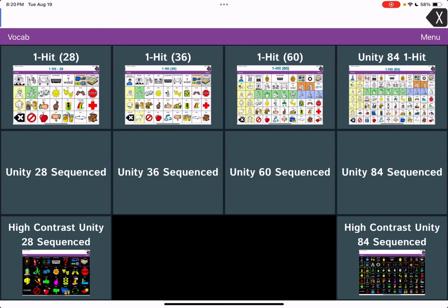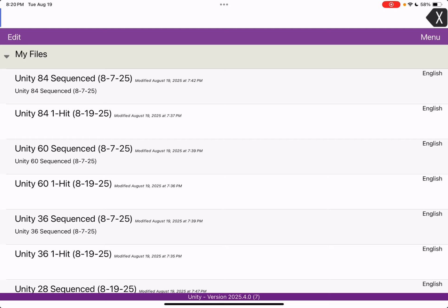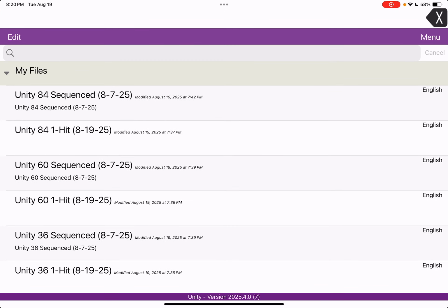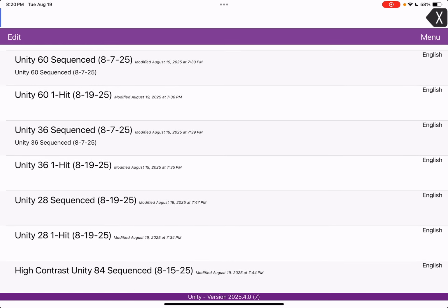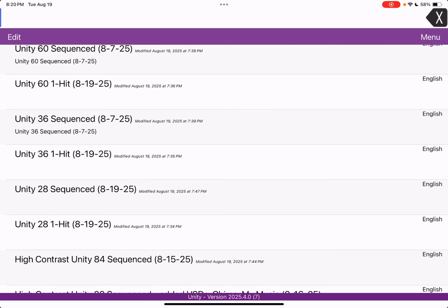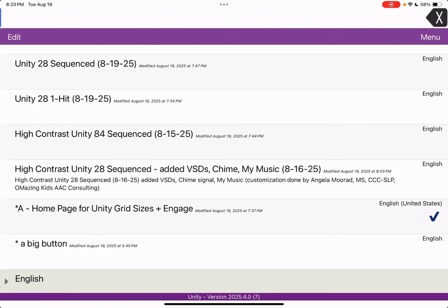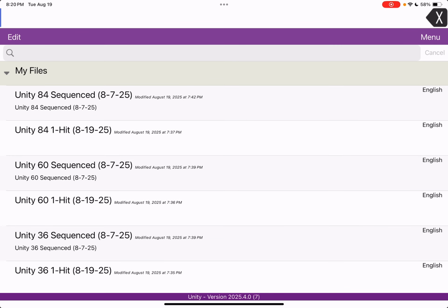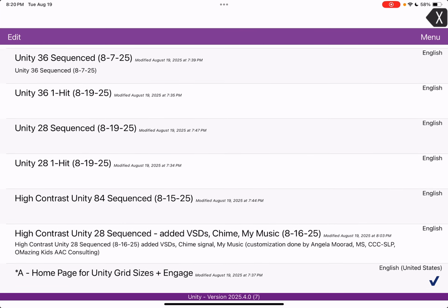So here is a tip. In any of the PRC Saltillo apps, of course you can go over here to this file area, but if you get quite a bit over here, it can get a bit arduous to find what you're looking for, and you can miss opportunities for engagement during an AAC session or AAC eval.